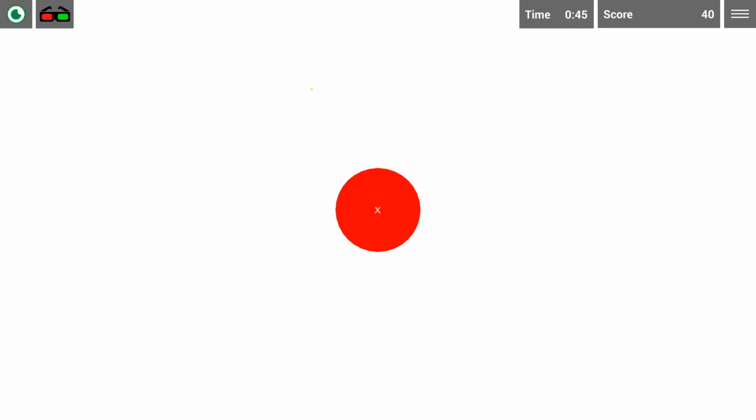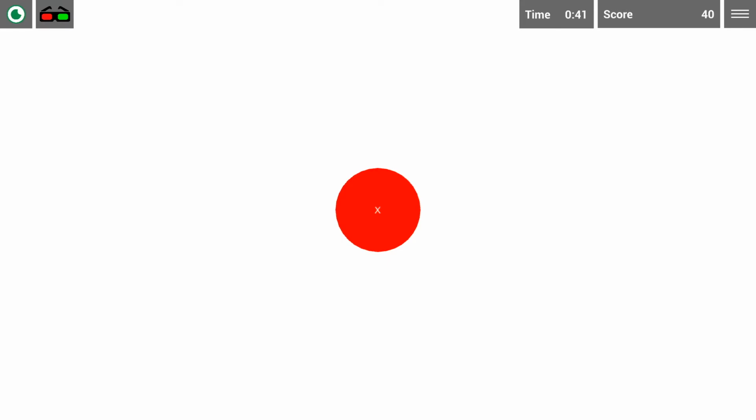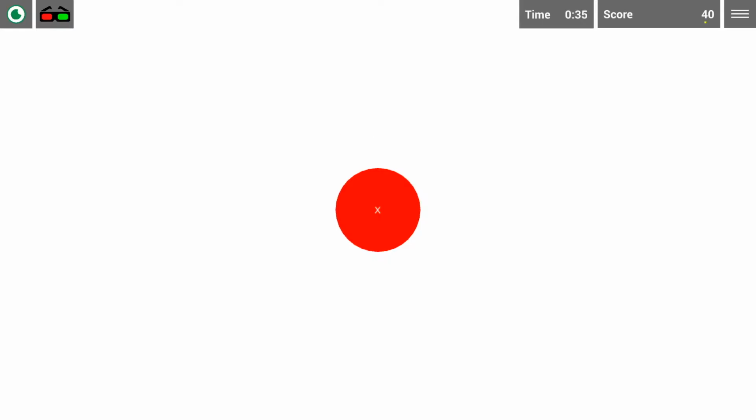And again, this activity also works with MFBF. You'll know this by the MFBF symbol on the top left corner of the screen here. And you can click that at any time and then toggle on your MFBF settings.